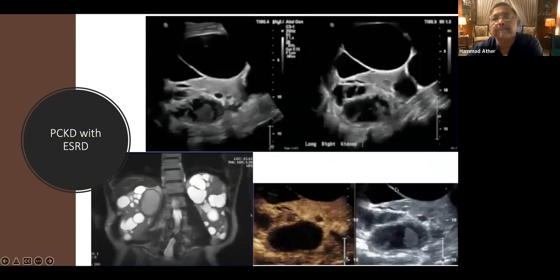If you look at the ultrasound here, this ultrasound shows that this is irregular. It has thick septa. And according to this ultrasound, it definitely seems to be a highly suspicious lesion. Whereas this is a grayscale, this is a contrast-enhanced ultrasound. And quite clearly, there is no enhancement in this lesion.